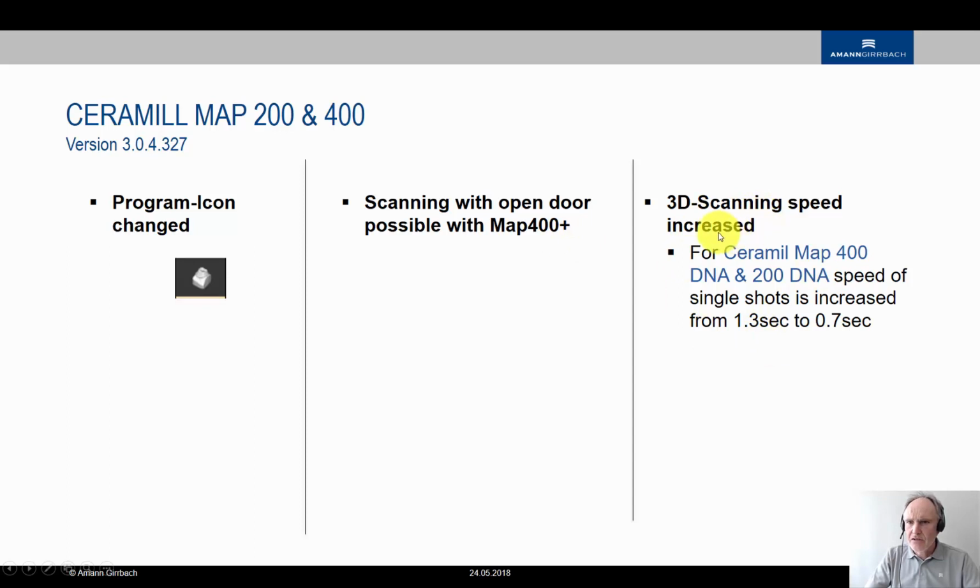And the 3D scanning speed has now really increased. You can feel that it's now cut down from 1.3 seconds to 0.7 seconds in a single speed rate. So you really feel that it's a really quick advantage now.